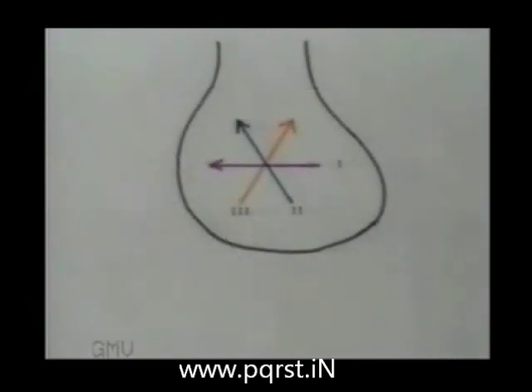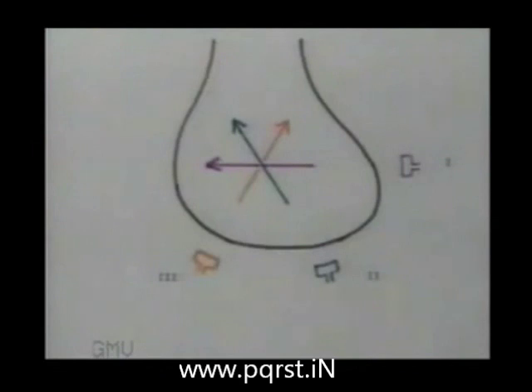Let us now overlap the directions over the heart. And the next diagram will show the leads as to how they look at the heart, or the directions from which they look at the heart. Lead 1 from the left side and leads 2 and 3 from the inferior side.